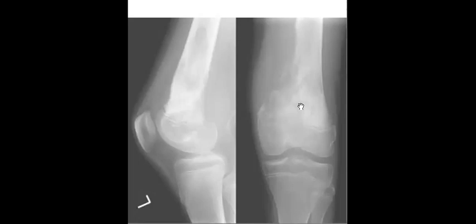Osteosarcoma is from 10 to 20 years old, metaphyseal. It can mix lytic and sclerotic behavior. The most important thing to mention is the periosteal reaction. If you find any malignant-looking periosteal reaction, and if there is any associated soft tissue mass, maybe in the MRI it will be clearer. And if this patient has something like a whole body scan, you will mention that you will search for skip lesions. Okay.